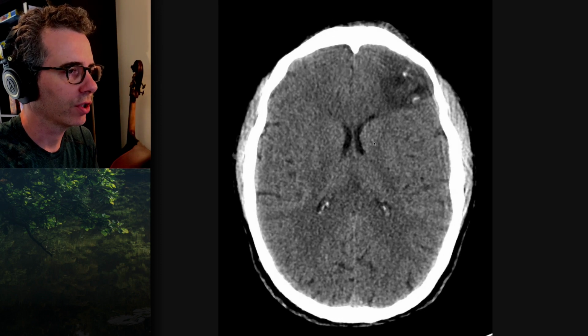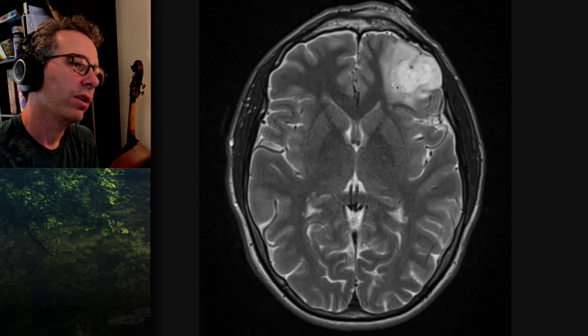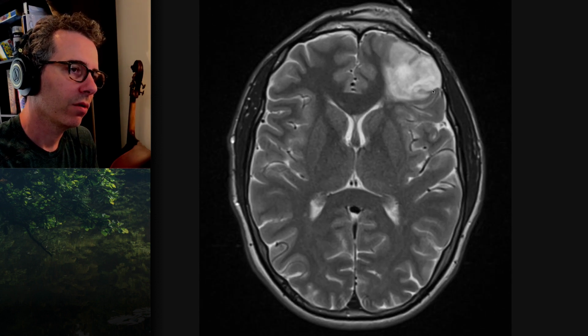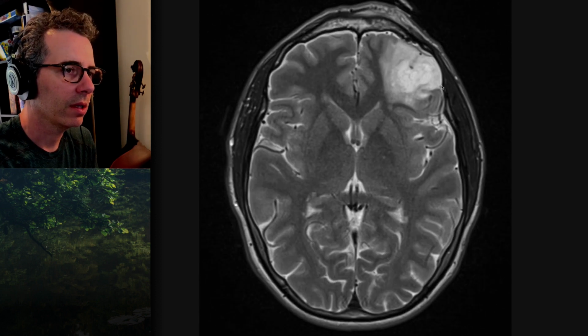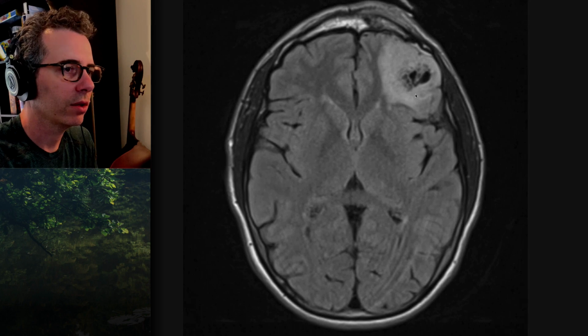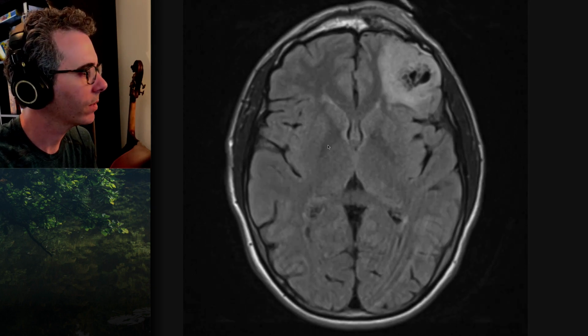You cannot push that much bone through the frontal lobe without having a hemorrhagic contusion. Yeah? And then when you go to MR, you can see that a lot of this tissue is cortex. If you look particularly on T2, you can see whole areas of gyri that are expanded by non-enhancing tissue, which is typical of a glioma.